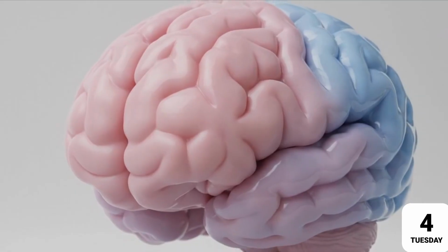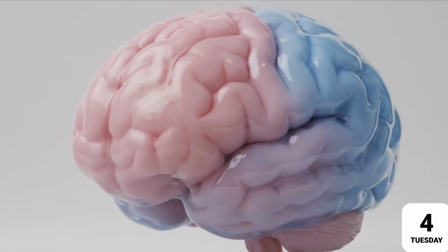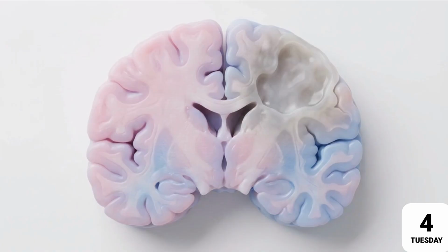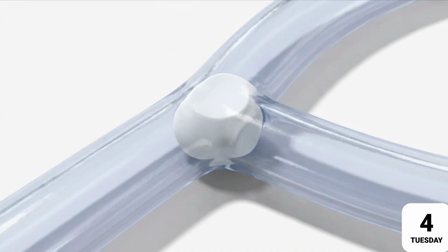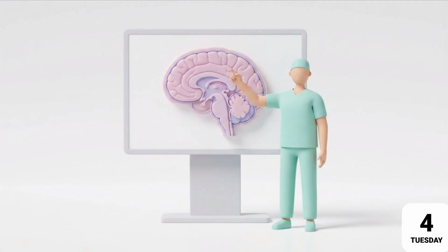An ischemic stroke creates the exact opposite visual signature. When brain tissue is starved of oxygen by a clot, its cells swell with water. Because water has a lower Hounsfield value than brain tissue, the dying area appears as a dark, hypodense patch. On rare occasions, the scanner captures the hyperdense vessel sign, a bright white clot physically wedged inside one of the major cerebral arteries. On the monitor, bright white signals an active bleed, while dark gray points to dying tissue. Recognizing this difference instantly dictates the ER doctor's battle plan.